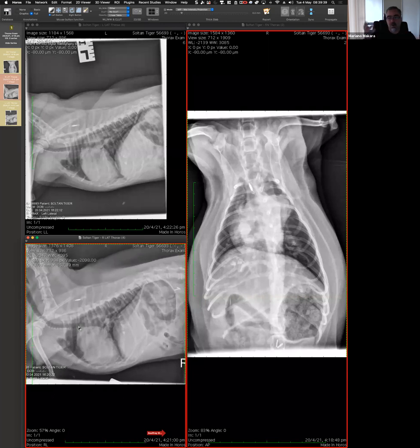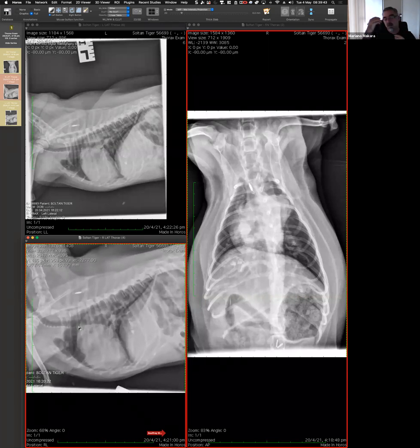Okay. Cushing could be a cause for, I'm just thinking aloud again. Yeah. Pulmonary thromboembolism, that's one option. Any chronic lung disease can result in pulmonary hypertension. And the lung doesn't look normal, doesn't look hugely abnormal. It doesn't look like an acute edema, but there is an interstitial pattern. So can it be an interstitial lung disease resulting in pulmonary hypertension? I think so. That's certainly an option that I would consider.